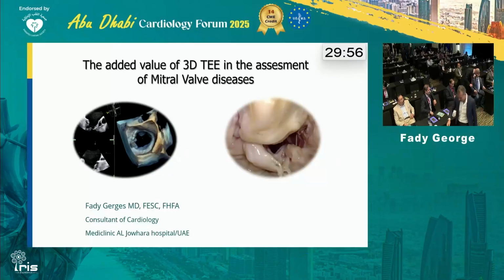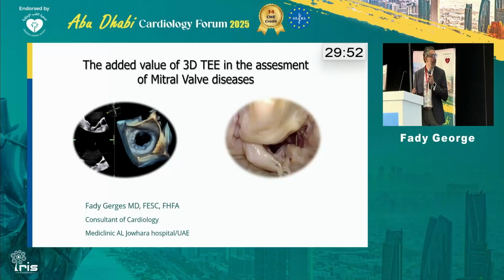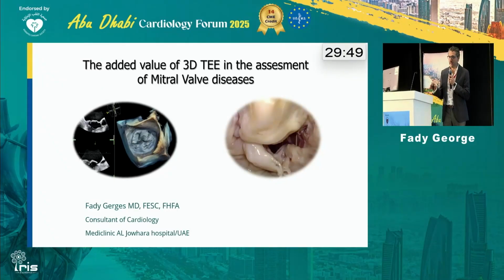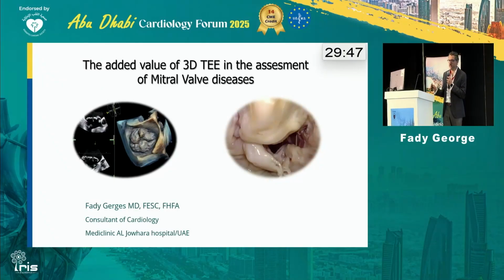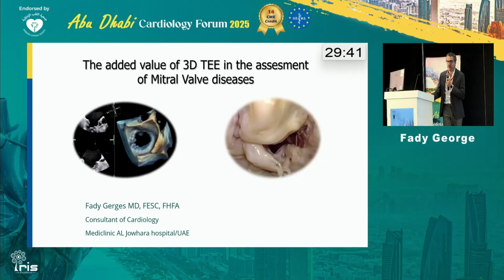Good evening, everyone. So let's get a little bit of 3D imaging by the end of the day. This is basically a workshop. It's not a hands-on workshop, but I'll let you go through a lot of how to do 3D imaging, how to take views, starting from the intubation of the 3D probe, even from the anesthesia of the patient, and different views, and how to assess specifically the mitral valve.